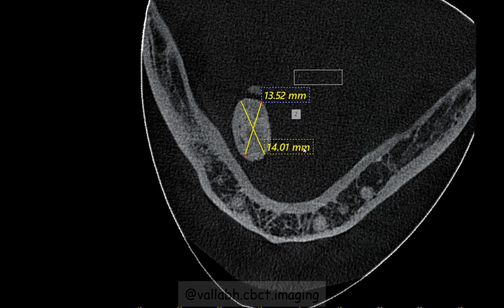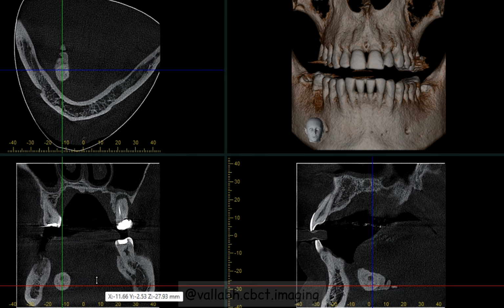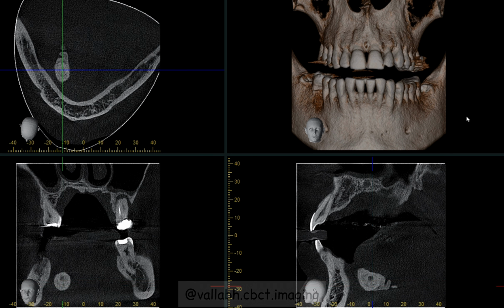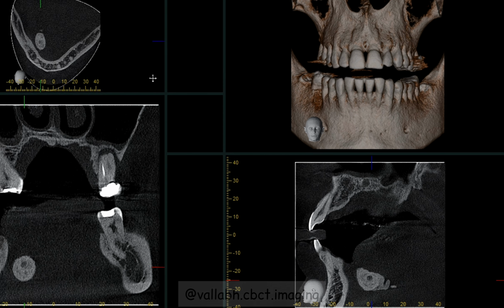These gland stones are basically formed due to blockage of saliva or due to calculus deposits in the salivary gland ductal system, and attention is needed for the removal of such stones, otherwise it may lead to pain and swelling in the salivary gland region. We'll study the salivary gland stone in different cross sections.